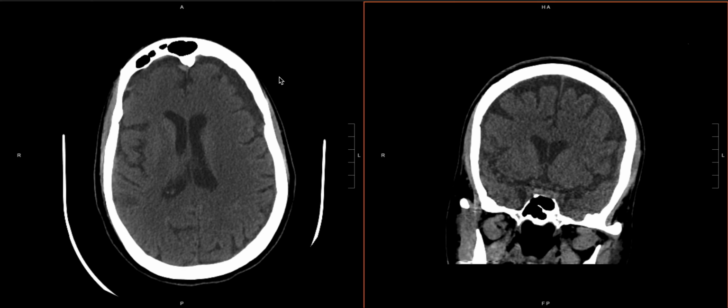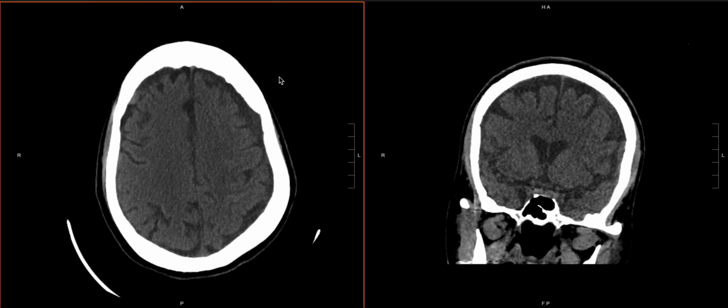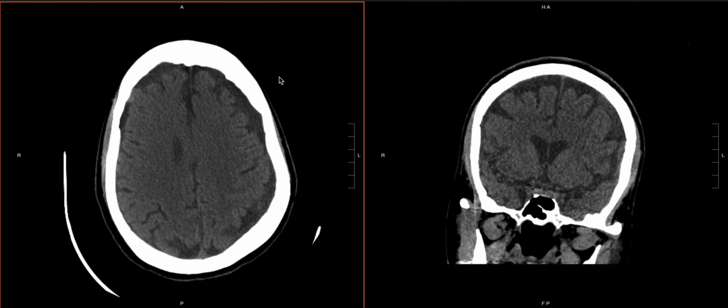So long story short, what this looks like and most likely represents is bilateral chronic subdural hematomas that have an acute component. So you don't want to write this off as all being chronic because you see hyperdense blood products. There is acute bleeding here, and it needs to be followed in a similar way because these collections can grow and become clinically more impactful. So at the end of the day, don't write everything off that's low density, and just because part of it is low density doesn't mean that all of it is.